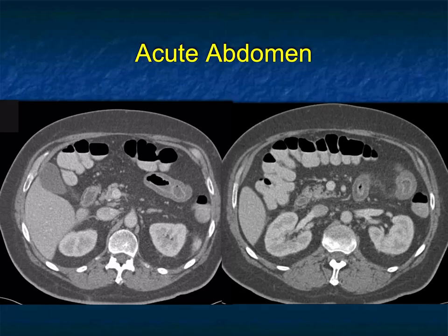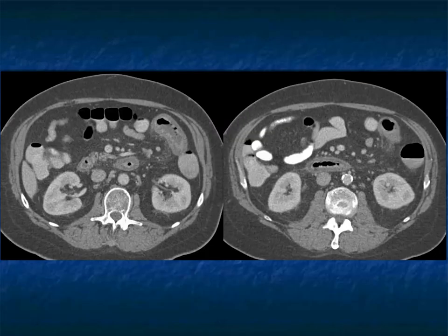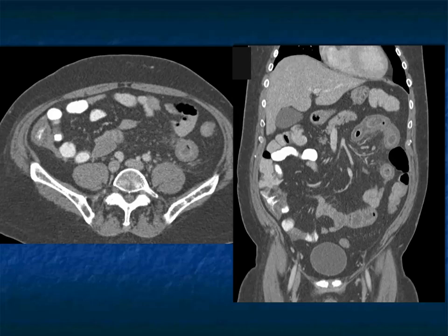Another patient, acute abdomen, oncology patient, multiple thickened small bowel loops proximally, haziness in the mesentery. You can see it very nicely. So I'm thinking, could this be ischemia? Could this be inflammatory? Could this be graft versus host disease? But that's usually distally, but we could think about it if the history matched. Could this be ischemia? Could this be chemotherapy?